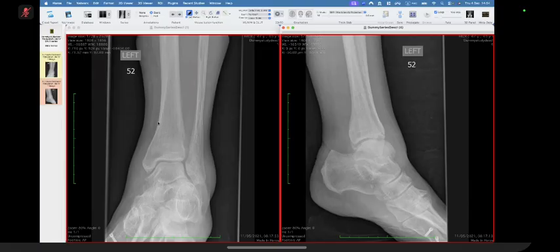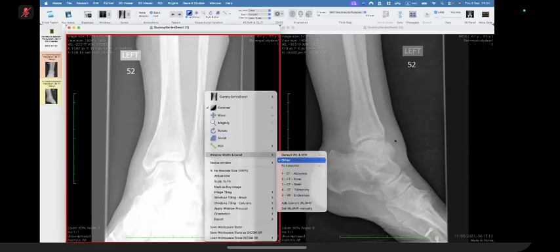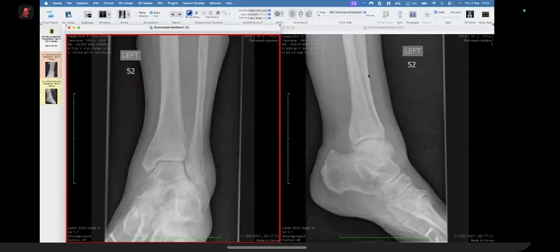There is a periosteal reaction seen. Let's go on to the lateral view. See the cortex. And then what do you see here? There is a periosteal reaction. We're going to stop there because otherwise you're not going to be able to get the feedback.